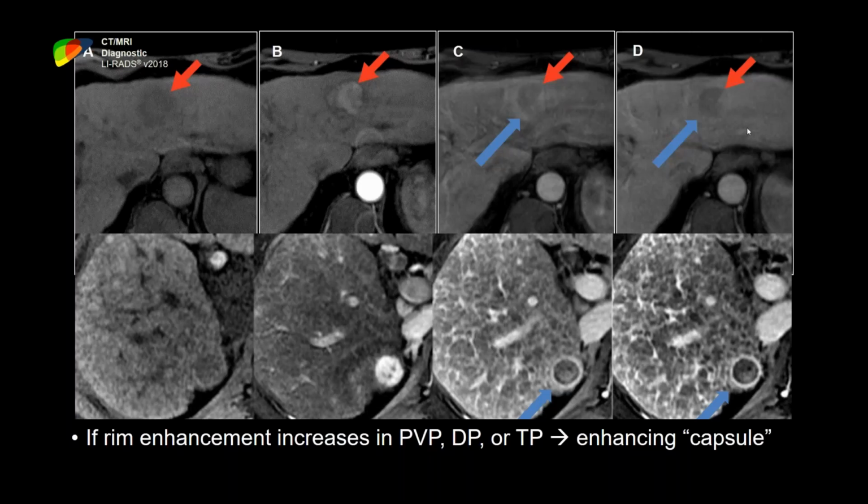Yeah. So often in cases where there's a lot of perfusion surrounding the lesion, where on arterial phase it looks bigger, or on the portal venous delayed where you can't really tell, I will sometimes measure it on the non-contrast, because sometimes I think you can see the margins really well on the non-contrast. Is it Michelle?